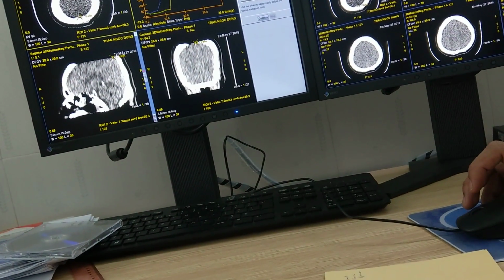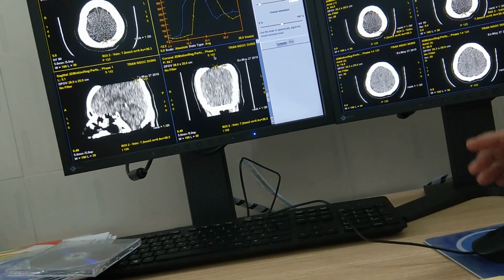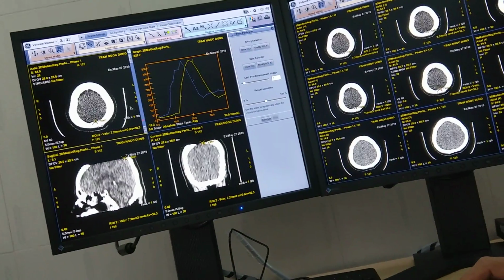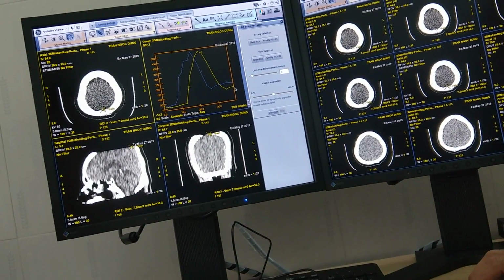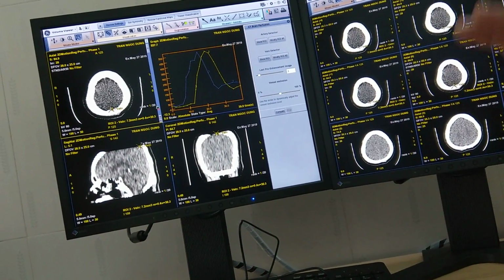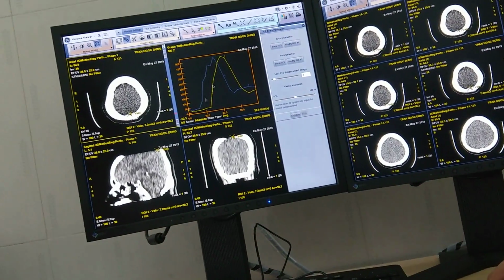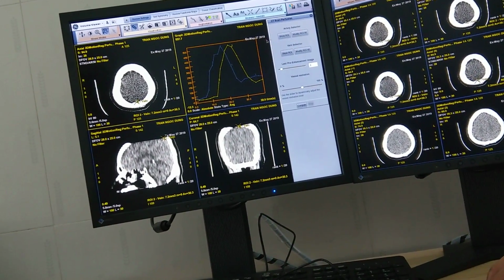This is axial, right? Yes, axial scan. So one rotation, one gap. Okay, so if you use one rotation, one gap, this is 40 seconds, right? So you have 20 images. So when you click first, it's automatically in review setting. So we try to look for the artery and vein. So the artery is selected. You want to look where it is?